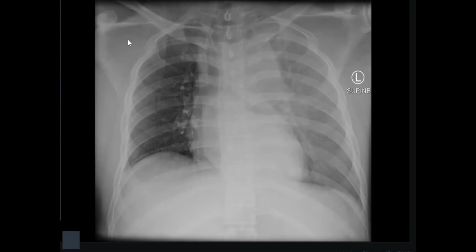I will look for you, candidate 5, but now just comment on the plain radiograph. Trauma, middle-aged patient. I've been presented with a frontal chest radiograph of a middle-aged patient.